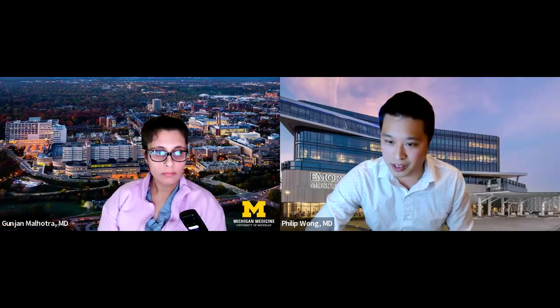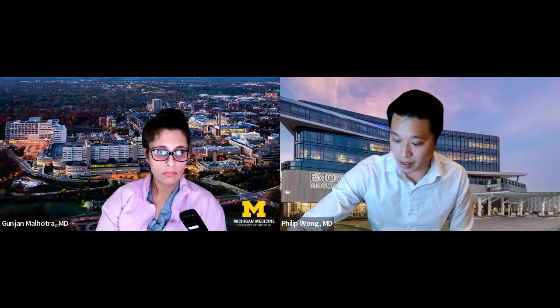We don't really do that at our institution, but it does a good job of suppressing the vessels and preventing vessel contamination, because it can be hard to tell in certain cases: is that a vessel or is that a nerve that's coursing through? And if it's a nerve, then it's really bright and something's wrong. We don't have that protocol set up yet, but I know there are several institutions that do contrast-enhanced MRI for traumatic plexus injuries.